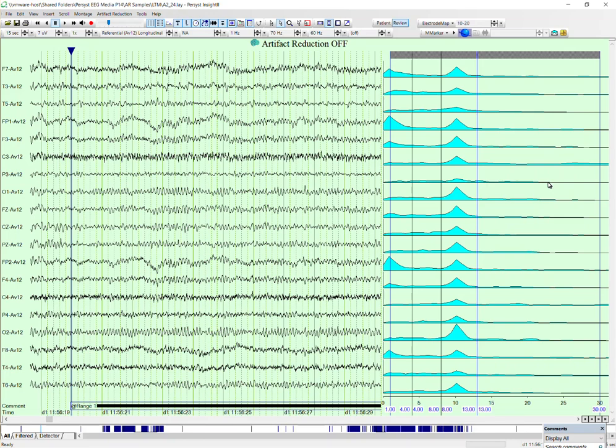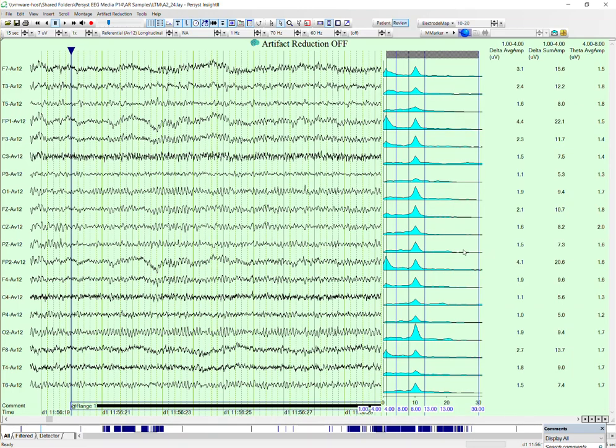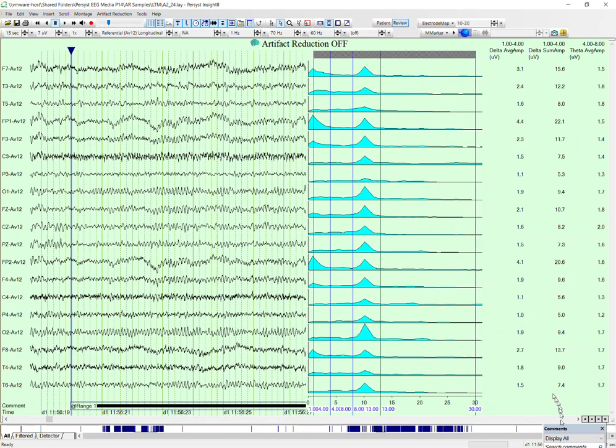And you can see it's marked these off on this display. So what can we do with this then? I can right-click on this, insert a vertical adornment, and put in a table of values. And I can move this over a bit because, again, I've already told it to use it.